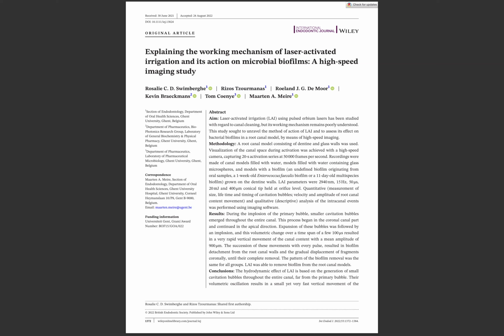The succession of these movements with every pulse resulted in biofilm detachment from the root canal walls and gradual displacement of the fragments coronally until they were completely removed. The pattern of the biofilm removed was the same for all groups. Laser activated irrigation was able to remove biofilm from the root canal models.